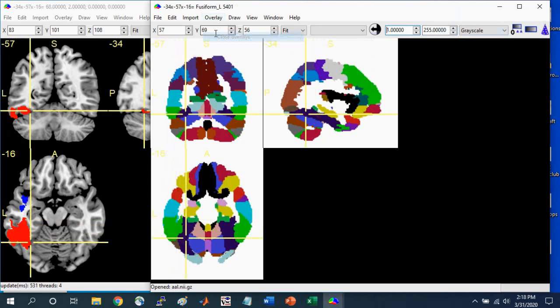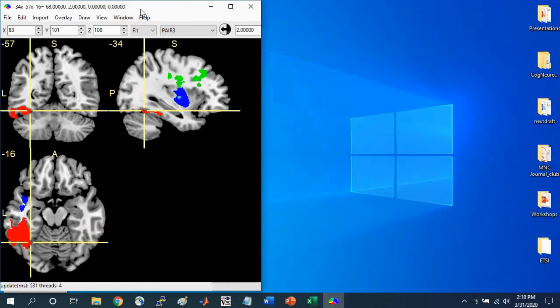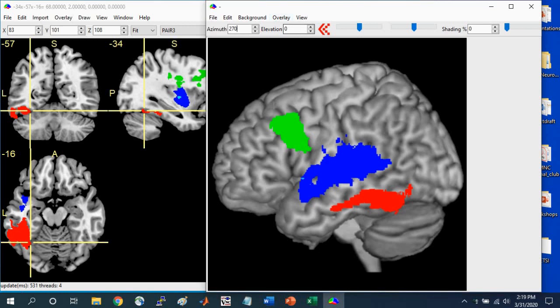So close overlays. Okay, the last thing I want to do is go over which cognitive deficits are associated with these lesion pairs, as I promised I would do. So I'm going to go to Window, Render. Generally speaking, the two patients here with brain damage consistent to this region had spoken production deficits. This is also termed Broca's aphasia, and it tends to be found in individuals with damage to the left inferior frontal gyrus.